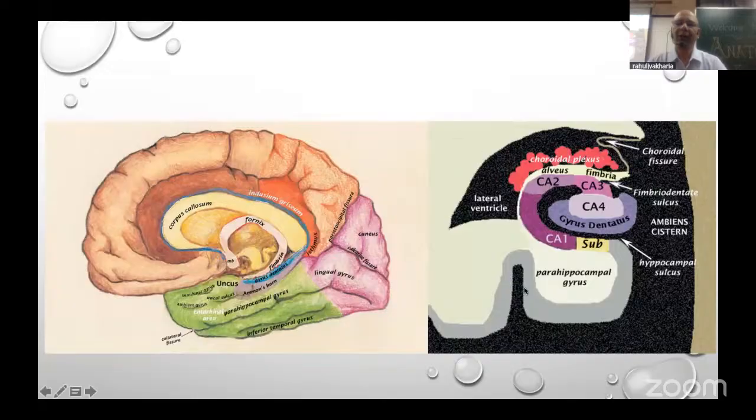Now I was just telling you about the subiculum. So this is the hippocampus. If you can see, this is the temporal horn. This is in the coronal plane. We are cutting the brain in a coronal plane. This is the parahippocampal gyrus, and it turns like this laterally. The first part you hit would be the subiculum. The subiculum will continue with the cornu ammonis, which is 1, 2, 3, 4, and then down below would be the dentate gyrus. A small thin line that you are seeing out here is called the alveus, which thickens medially and forms the fimbria.